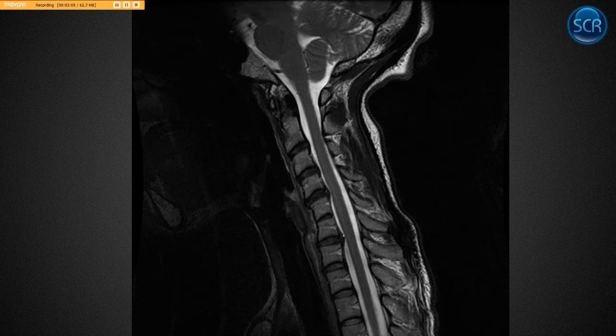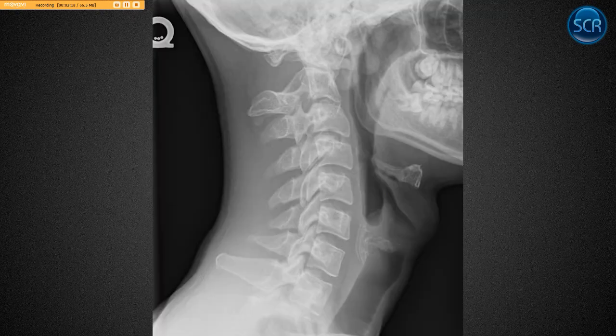This is their MRI, and you can see adjacent to that, they do have some degenerative changes where they have disc bulging, which effaces their cord here anteriorly and kind of indents it actually a little bit here at 4-5. So that is causing actually a little degree of central canal involvement.